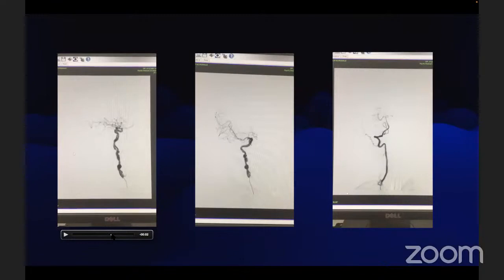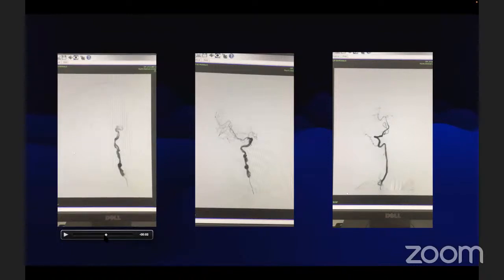It's not duplication, sir. I'm not able to see that. Can you point it out? There, that part. There is a gap in that, and above also. Here also, that part too. Maybe dissection. So why duplication only at two parts?